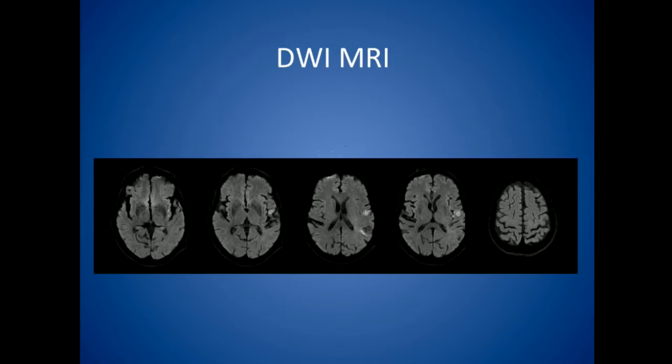Well, we do an MRI, and very quickly we find out exactly what has infarcted. So we have an infarct in the temporal lobe. This is diffusion-weighted images. This sequence takes about 4 minutes, and that's really all we need. Usually it takes more time to transfer them to the MRI than it actually does to take the sequences. So within the time that we're setting up, we're already getting these images. By the time we're getting all our flush bags ready and everything, we have these images and we can make a decision. And this is a small infarct.